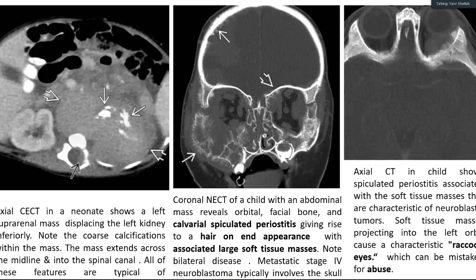So this was a relatively rare case, but as opposed to the neuroblastoma that you usually see in adrenal origins, this is a pelvic neuroblastoma. Usually you see it like this, which insinuates between the structures. It has usually coarse calcifications, and near the midline it crosses the midline.